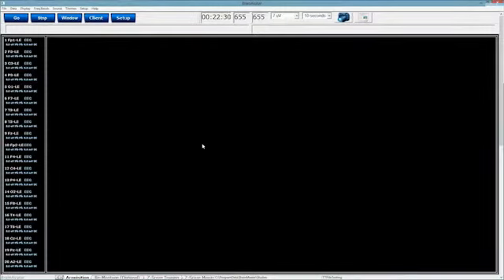PZOK-UL basically says, I'm taking a whole bunch of Z-scores, and I want to look at the percentage of those Z-scores, and I want that percentage of Z-scores to fall above the line that I'm setting right there. This is more of a specific region of interest, a specific band, and training that particular Z-score. So, as I was saying, this is set up with S-Loretta Z-score training to a particular region of interest and a particular band. There are ways, of course, to do region of interest training. The way I set this up here is in the same PZOK-UL style, only to that region and band, and that's having an upper and lower threshold.